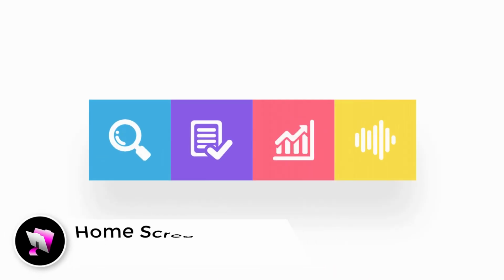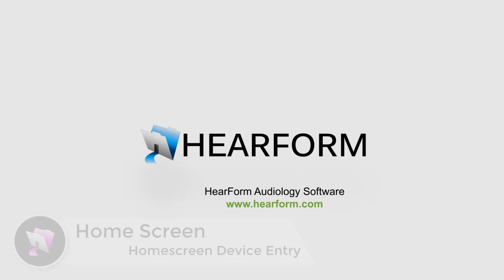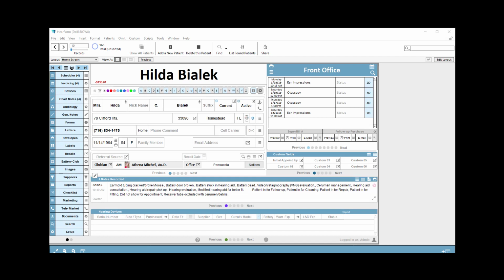Welcome back. This video will explain how to enter hearing instrument devices on the HearForm home screen. Please excuse a little bit of redundancy in this video, but I want to make sure we cover all our bases. You'll notice at the bottom of Hilda's home screen we do not see any devices assigned to her.